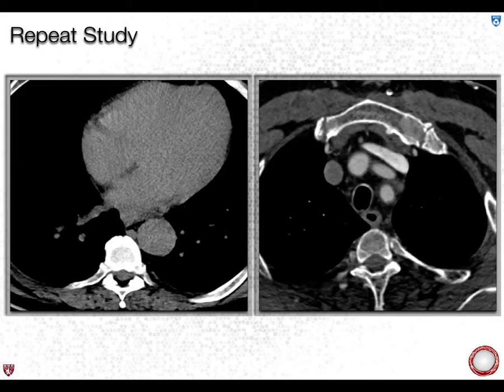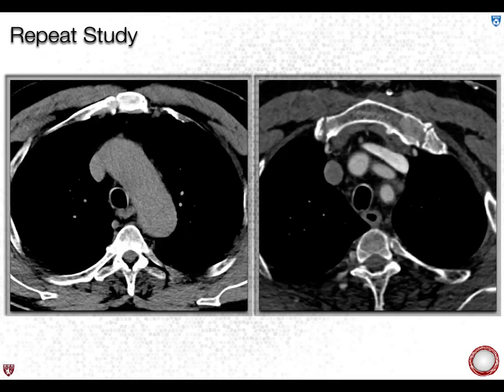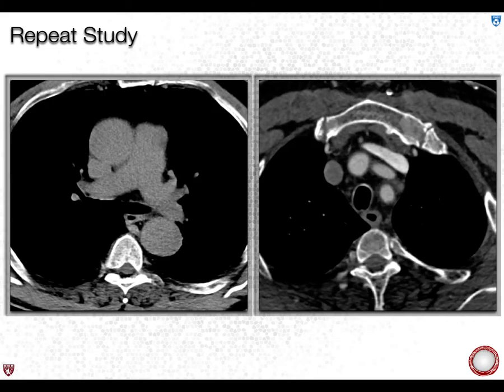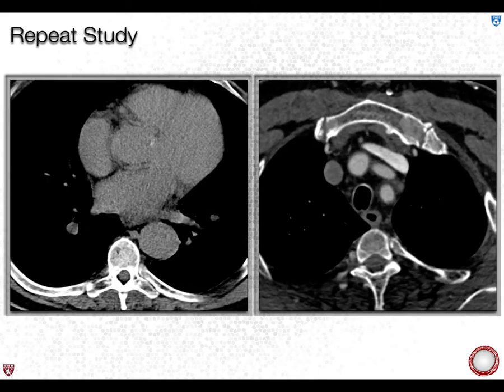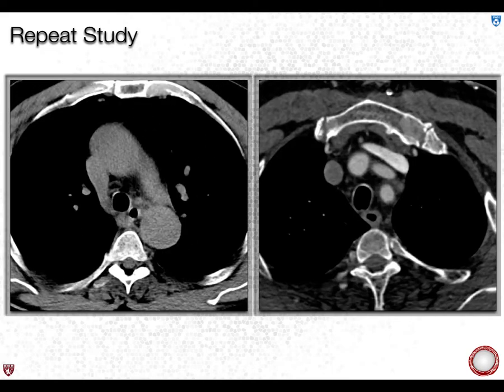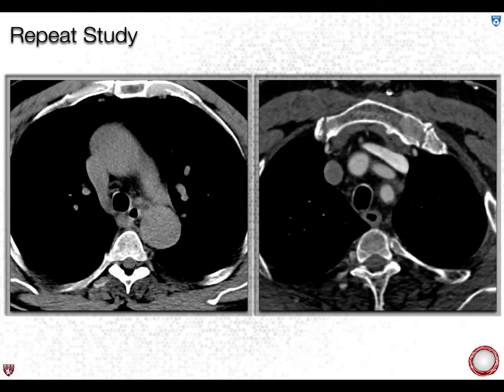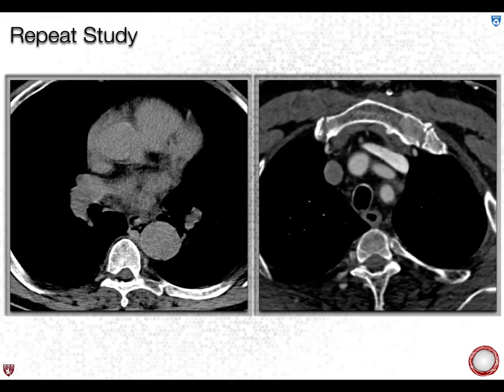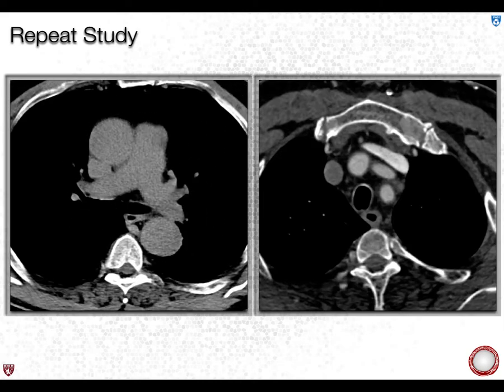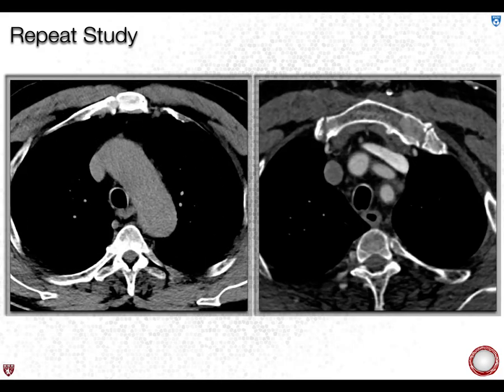That's right. So we measured the Hounsfield units. It took us a year to figure this out. Actually, more than a year for me and Aaron honestly to figure out why this patient's IMH went away. Well, we measured the Hounsfield units in the blood pool, and it's 70 Hounsfield units. But you would think intuitively, patient's renal function is completely normal. 4 hours later, their Hounsfield units are 20 Hounsfield units higher than they should be. So be aware that it takes more time than a couple hours to excrete the contrast.